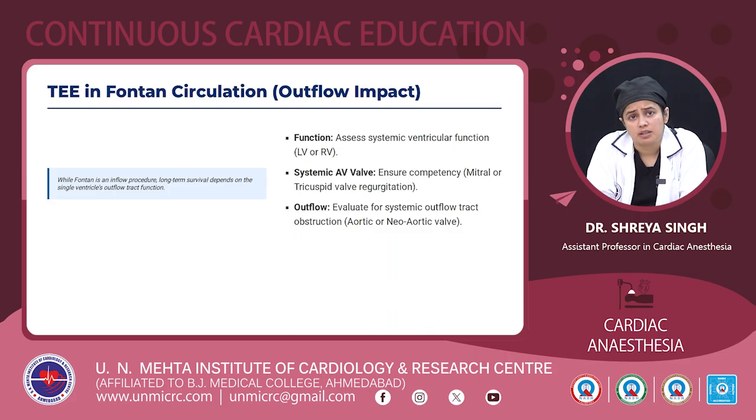Then TEE in Fontan circulation, we can assess the systemic ventricular function of the LV or the RV. We can ensure competency of the mitral or tricuspid valve and look for regurgitation. We can also evaluate for systemic outflow tract obstruction, at the aortic or neo-aortic valve in these patients.